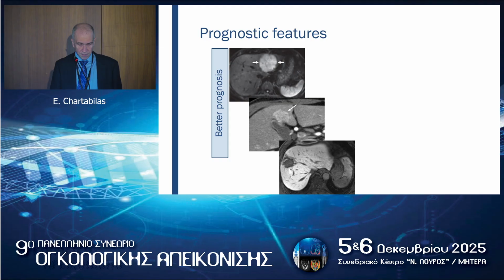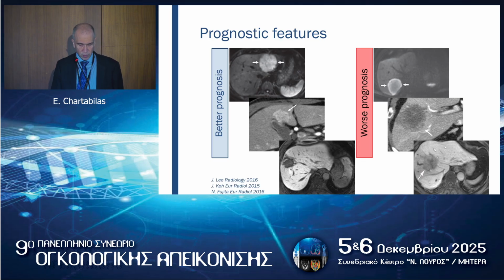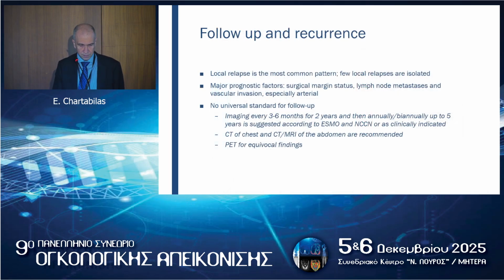And schematically, here on the left, you see the good tumor. There is homogeneous diffusion restriction, homogeneous enhancement, and no cloud-like enhancement with hepatobiliary phase. While on the right, there's a bad tumor, the typical cholangiocarcinoma: peripheral diffusion restriction, peripheral enhancement, and central enhancement after Primovist. So the more the fibrosis, the worse the prognosis.